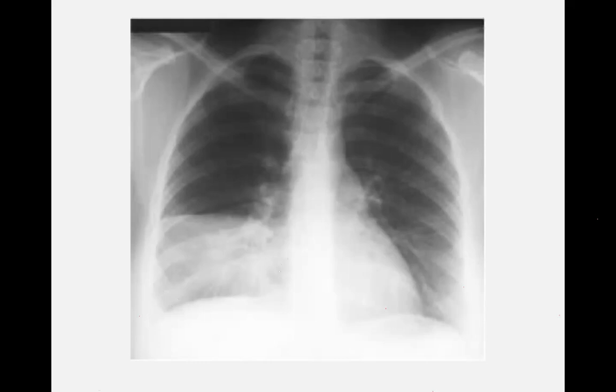That's why you need a good penetration, because you can't really tell if this is from the penetration or from the consolidation or the opacification. But because we know it's an under-penetrated X-ray, you can see here the costophrenic angle is kind of visible, and there's no fluids below the diaphragm, and everything else seems normal.